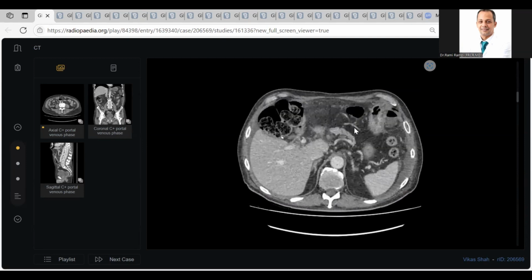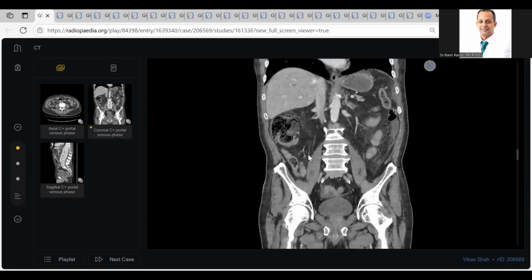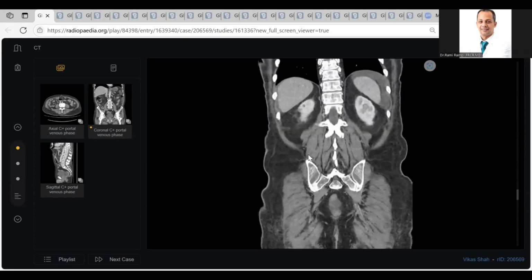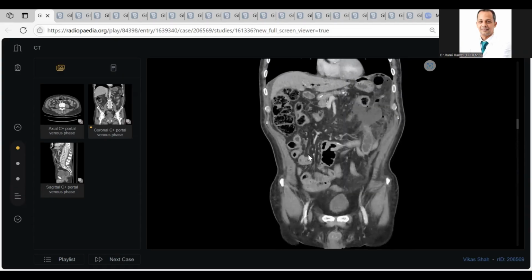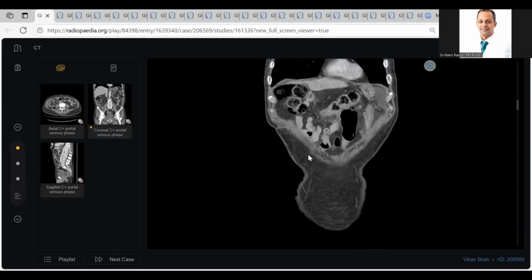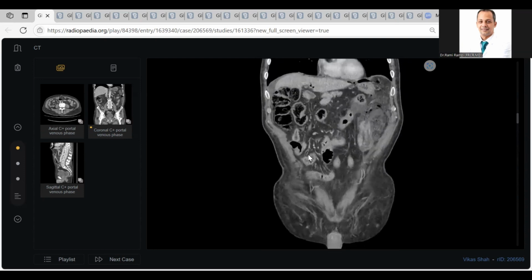Next candidate, welcome. This is a perforation or a leakage of a gastrojejunostomy. Doctor, I don't know the name of the operation. Okay, tell the examiner, leave the mouse, please. Tell the examiner the site of anastomosis or operation is leaking, perforated. The site of operation, there is leakage. Like this, he will be happy.